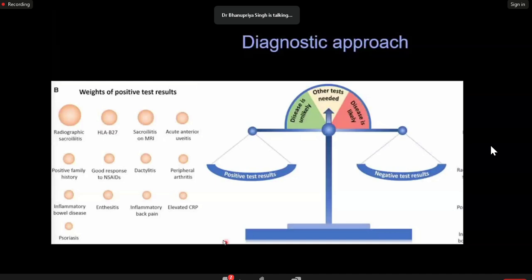Then comes the HLA-B27 serum marker. After that is the role of MRI. You have to remember that over-enthusiastically reporting isolated MRIs, especially of the spine and SI joint, is common, and we have the least history in these two cases only.